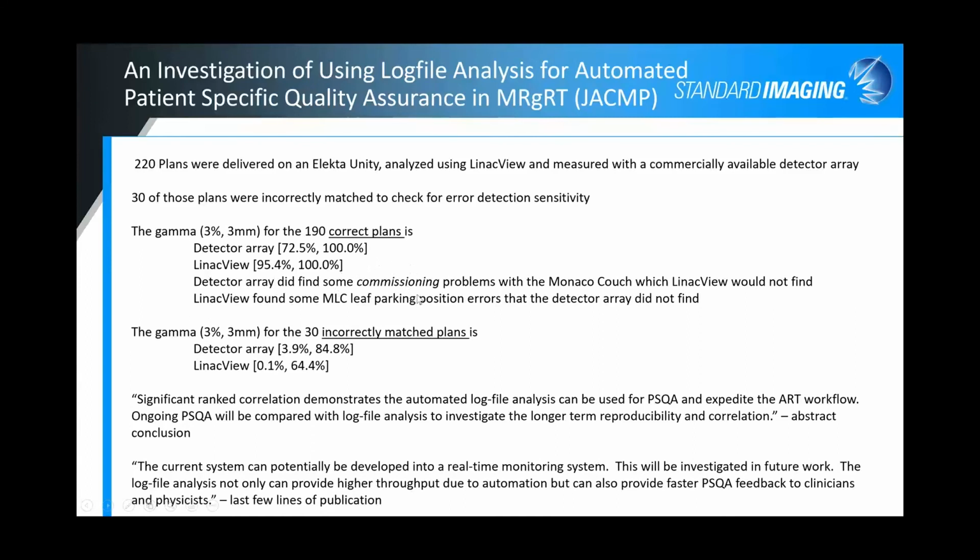So you must be aware of that, so it's important to have your system commissioned prior to depending solely on log file analysis. But LinacView at the same time did find some MLC leaf parking position errors that the detector array did not find.